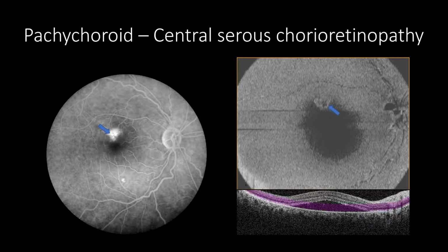The structural Enface images can help to have a panoramic look at the distribution and size of subretinal fluids in central serous chorioretinopathy, and the segmented slab may provide additional information about RPE changes.